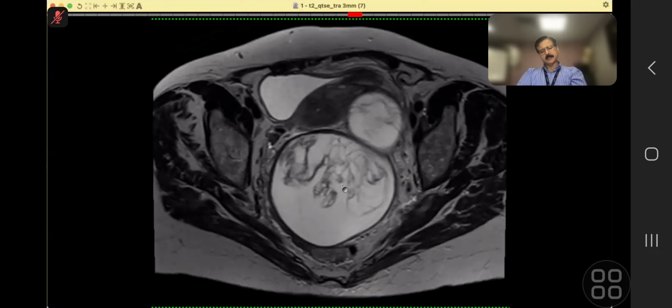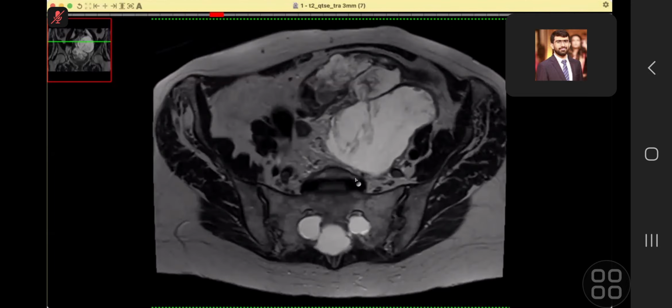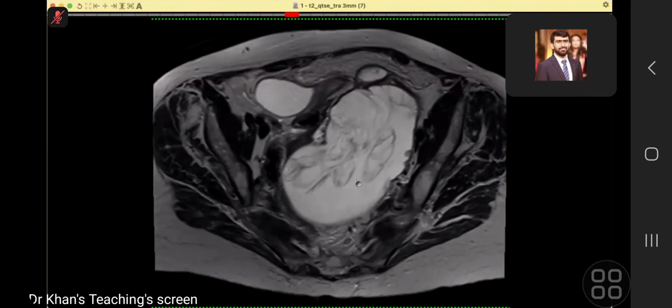For what, sir? I want to see whether these hyperintense signals are due to fat. It is not fat.